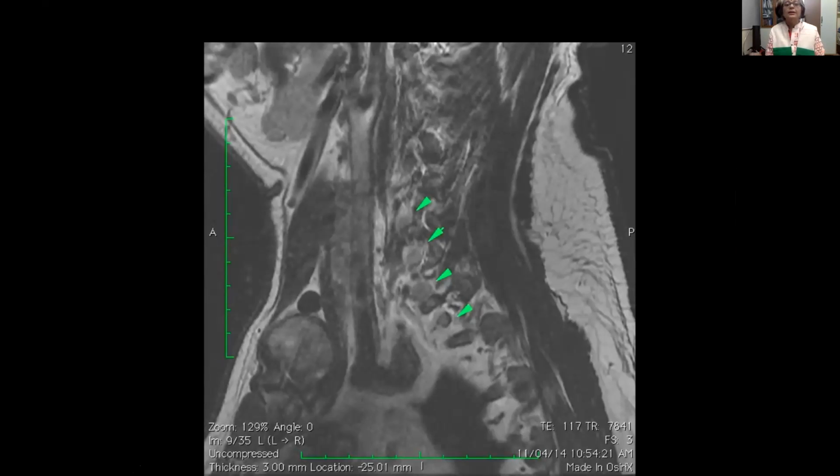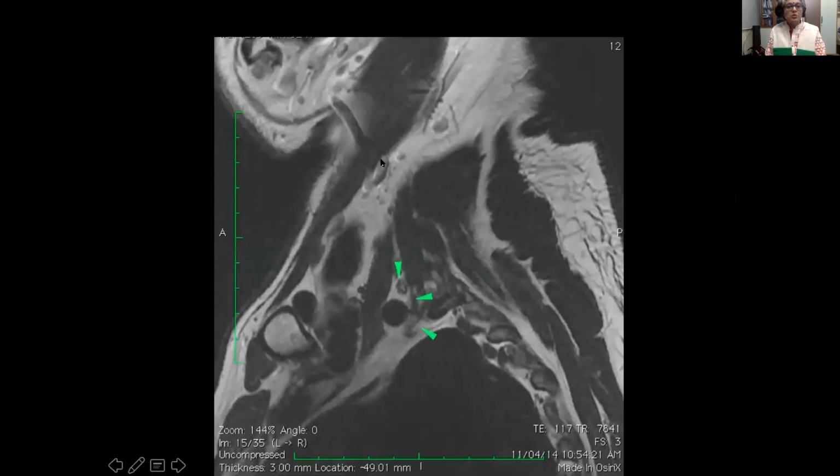Sagittal images, let's look at the anatomy. This is Sag T2 weighted image. I'm coming from medial to lateral. So here I can see the nerve roots, the dorsal root ganglion. You can see here. So from the foramen, the nerve roots have come out. As you come here, this is the interscalene triangle I spoke about. So this is the scalenus anterior. This is the scalenus medius. Between them is the subclavian artery. The vein is more anterior. So this is subclavian artery.